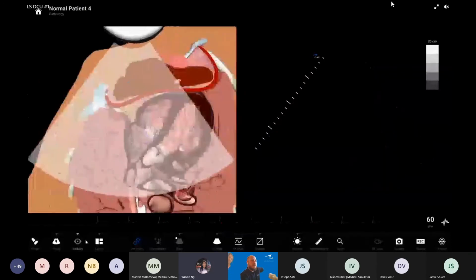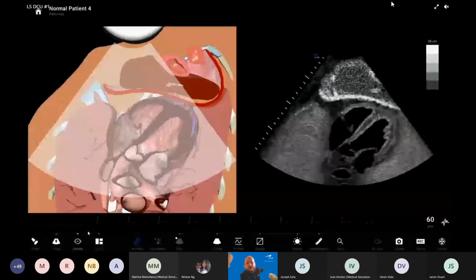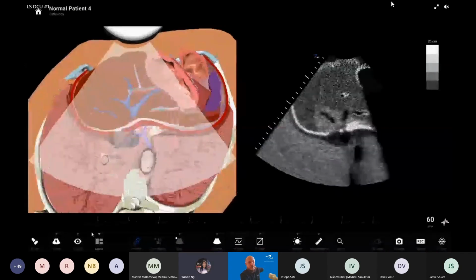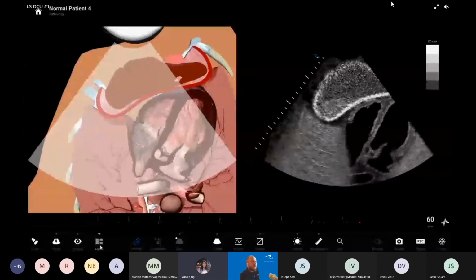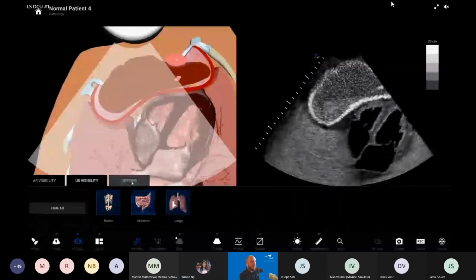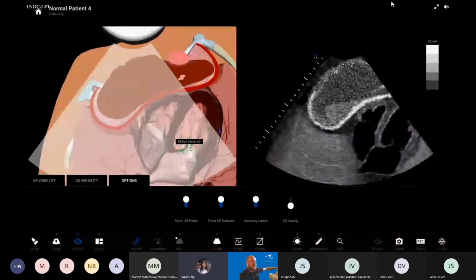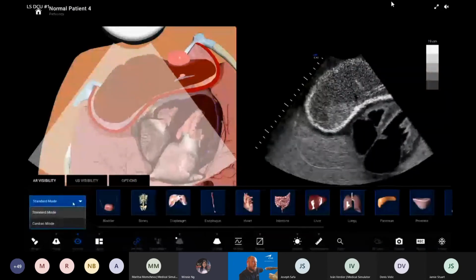Yeah. So Winnie, do you mean the highlighted structures I already showed? Because I'm not sure what kind of structures you mean. Can you take this over? The anatomy. Have you shown the anatomy? Yeah, I think I did already. Oh, okay. So just by highlighting, yeah? You mean this? Because I don't want to miss anything. Oh, no. So you click on AR visibility.